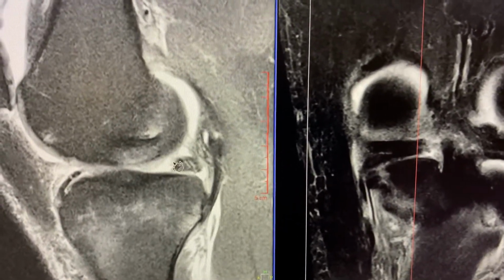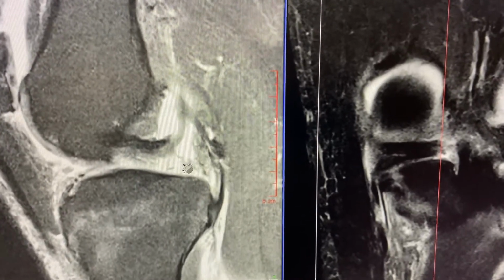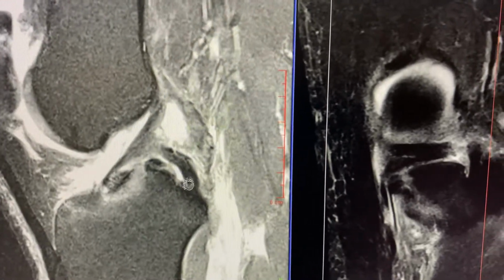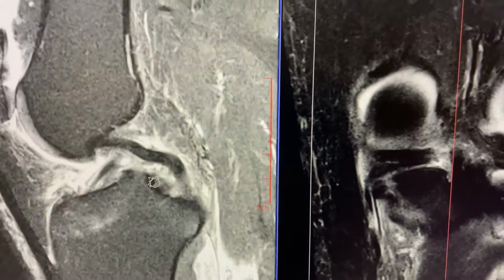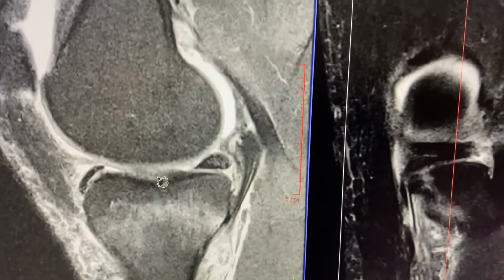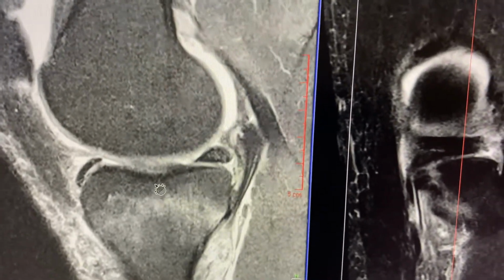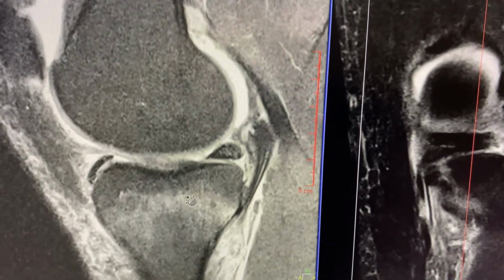You can still see meniscus. We are now in the gap and there's no meniscus. And that's why it's important to be able to look for that on the sagittal images. PCL, once again, go medial. We're in the gap, there's no meniscus. So disappearing meniscus sign, and then all of a sudden the meniscus pops back up. That is a solid finding for root tear of the medial meniscus. And once again, there is bone marrow edema.